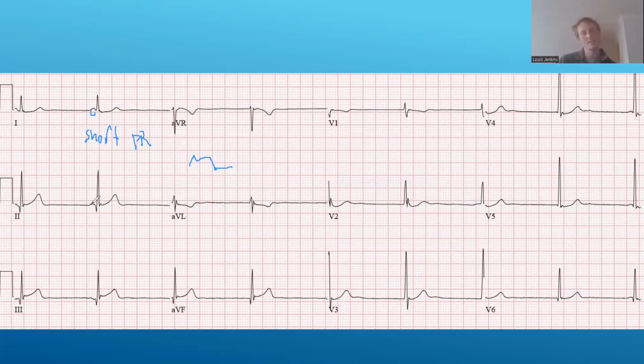If I look at the P waves in the other leads, it's like, oh my God, where are they? They're missing. That's weird. I can only really speculate as to why this is happening, but it would suggest to me that potentially this P wave is coming from somewhere that's not the SA node, not the normal place where P waves come from, and that might indicate some disease of the SA node, if this P wave is originating ectopically, which I think could be the case here.